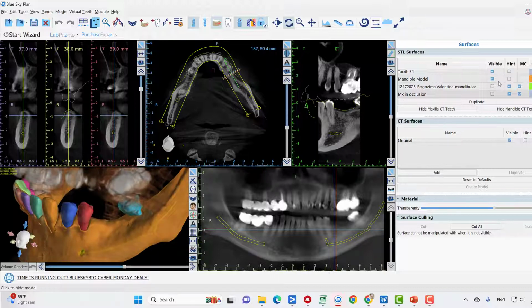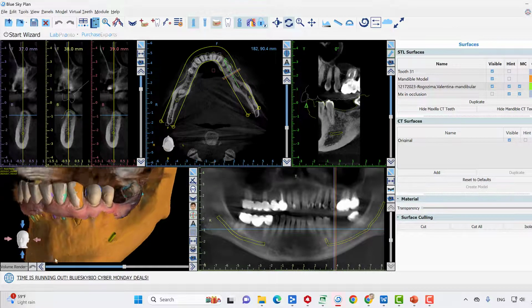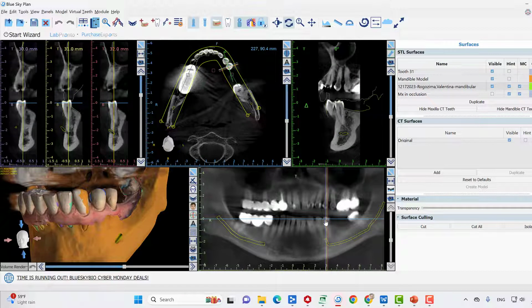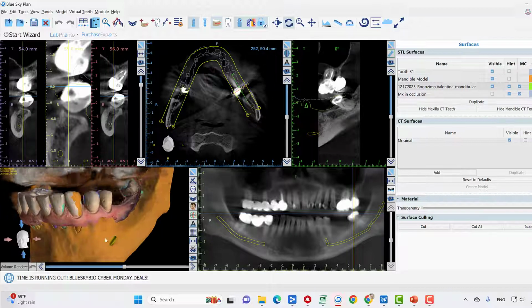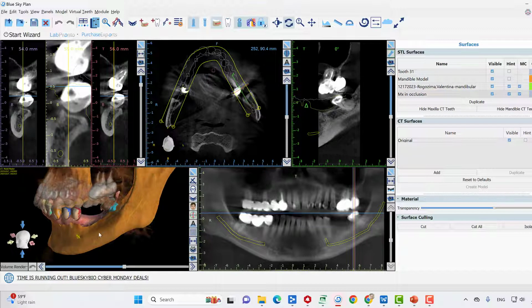All I'll then do is take the intraoral scans that I've taken, and I'll overlay that. It's also a simple drag and drop, and the AI will match everything extraordinarily well. We'll double check the outline of the tooth, and so I'm looking at here, see the green line, how closely does that hug the tooth. That's what's going to tell me how good my mesh is. We've done pretty well here. I will then bring in the maxilla, not so much to mesh with the top maxilla, but only to see in occlusion where I am.